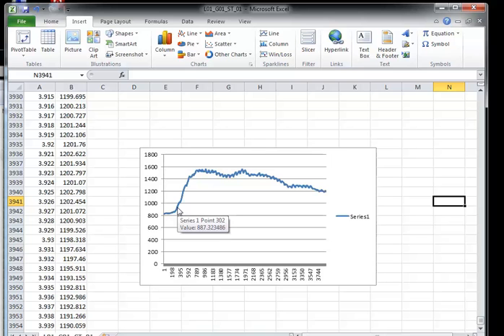So ideally what we need to do is come up with a way that takes out subjective interpretation of the graph. We need a way that is going to be the same for whoever does it, making it replicable, which is vital within scientific research. One such way is we could look for an increase in the force of 50 newtons over the baseline.